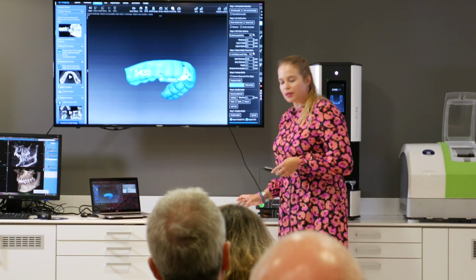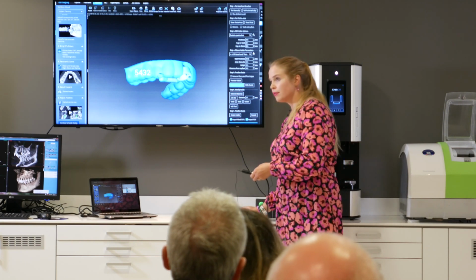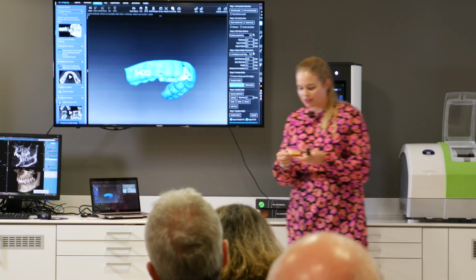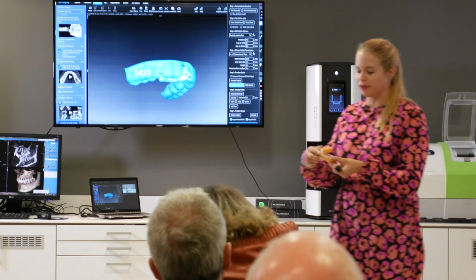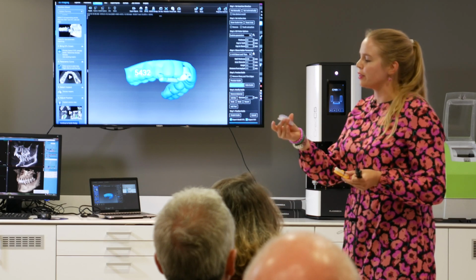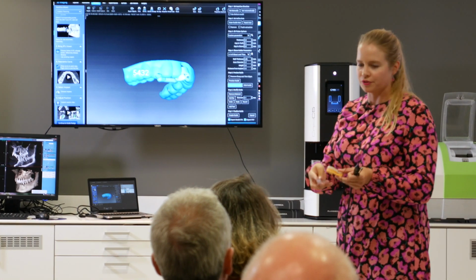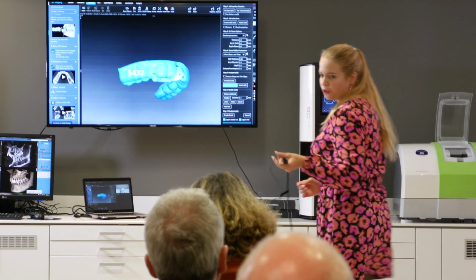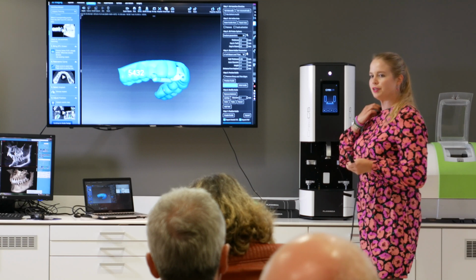Okay, so here we have 2 examples of a guide. The one is fitted here on top of a dental model. It has this metallic sleeve through which the drilling is done. And then this one here has come out of a printer, so it still has the supporting structures. So please take a look. So all of those, they are printed with our Creo C5 3D printer.